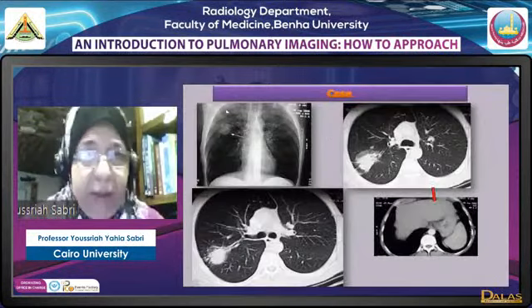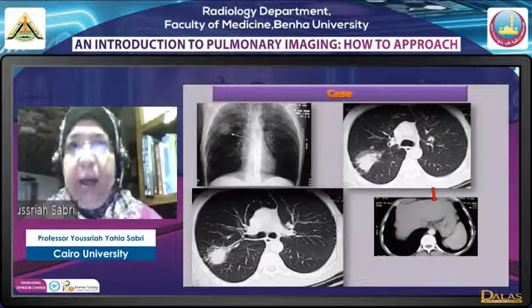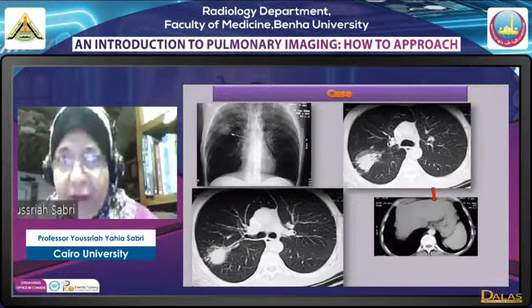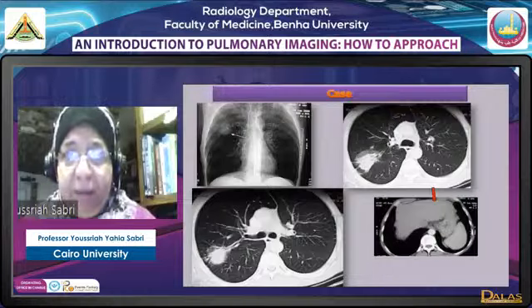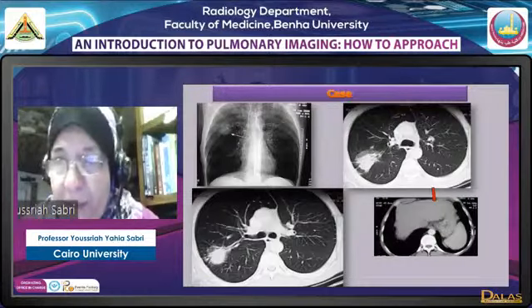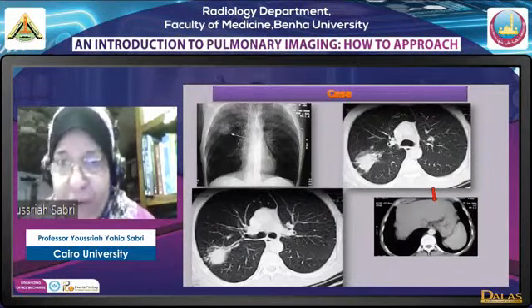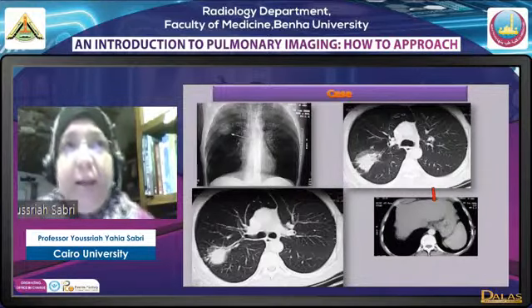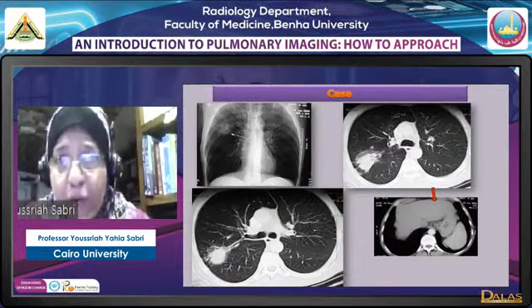طيب to start with ده ميل. يعني ايه الابروتش بعد كده؟ خلاص لقينا ان انا عندي well defined lesion. اول حاجه بشوف السايز، ثاني حاجه البيشنت نفسه، الايدج مهم جدا، في الايدج والجندر والكلام ده بيهمني جدا في ان انا ابروسيد بعد كده افكر في الديفرنشال دايجنوز. المورفولوجي اوف ليجن زي ما هنيجي دلوقتي، المورفولوجي اوف ليجن في اللانج ويندو او في الاكس راي، التيشو كاركترايزيشن وده بيستدعي ان انا ابص على ميدياستاينال ويندو في السي تي.